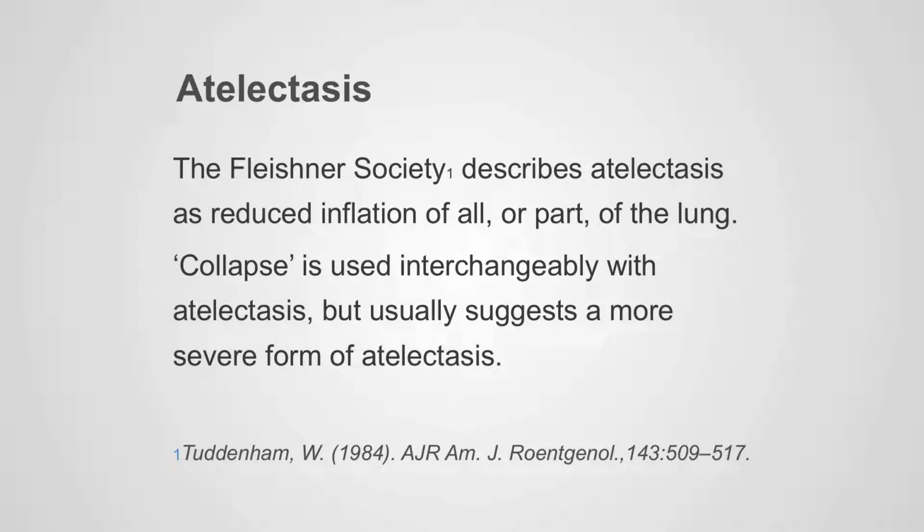Atelectasis is defined by the Fleischner Society as reduced inflation of all or part of the lung. Collapse is used interchangeably with atelectasis, but usually suggests a more severe form of atelectasis. Atelectasis is a frequently encountered abnormality on chest x-rays. Since the presence of collapse may indicate serious underlying pathology, confident recognition of collapse on an X-ray is an essential skill.